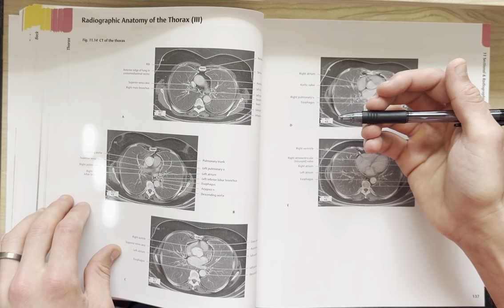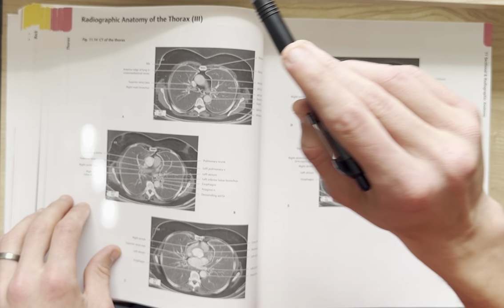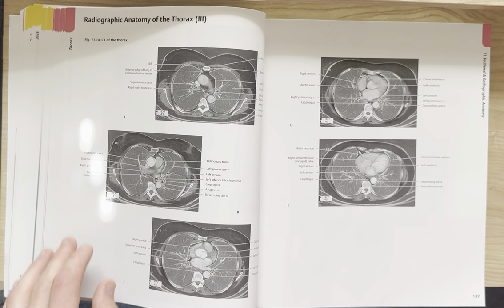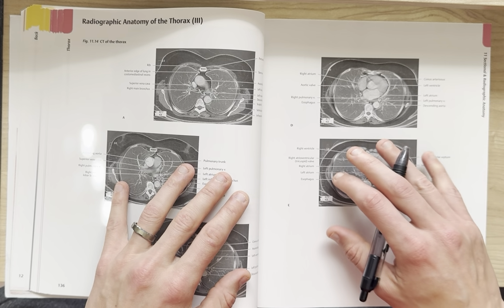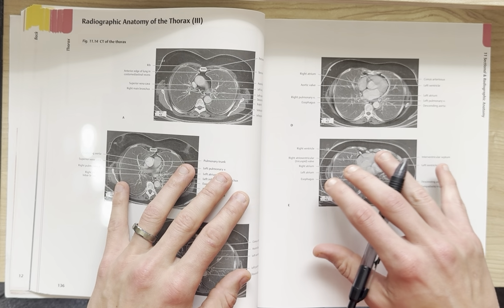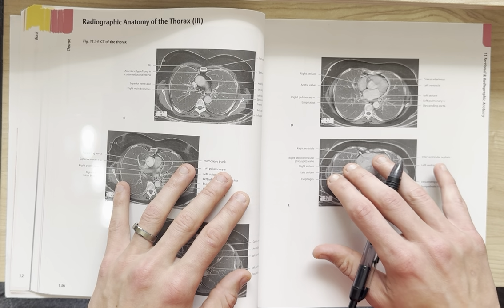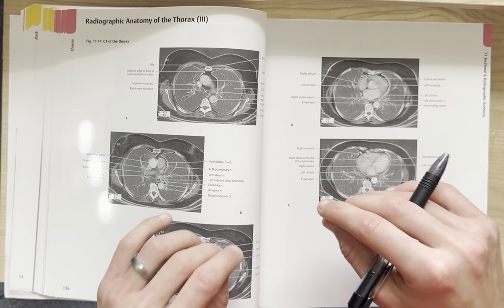What you can think of with a CT is basically it's also a big tube that the patient goes into, but it's much wider. And the radiation of a CT is much higher compared to an X-ray because a CT is basically just a ton of X-rays being done on a patient at once.